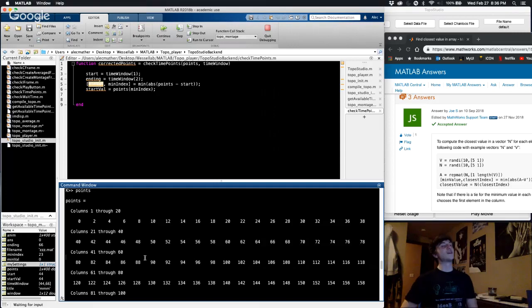I'm so stupid. Oh my god. I'm so dumb. Of course there's gonna be one in there because we're asking it to look inside of itself and be like, is there something that's close to you?